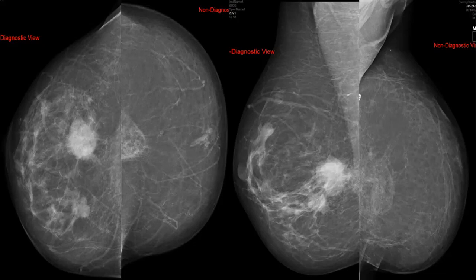Okay, so there is perilesional edema, and there are band-like strands, you see, extending towards the nipple between masses and going toward the nipples. So you have questions of multicentric disease. Definitely you have multifocal with questions toward multicentric disease and questions for bilateral involvement. And what about the contralateral breast, and the fat plane between the pectoralis?